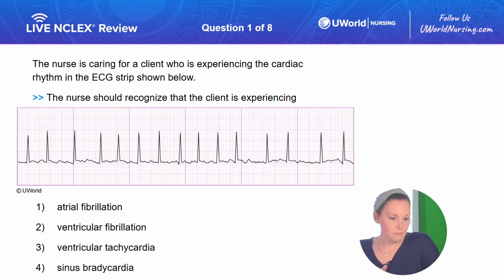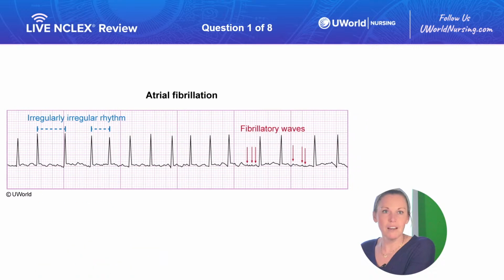Good work, awesome. All right, so good to see so many of you guys here today. I'm seeing a lot of option 1s, so that's great. Good work, you guys. All right, well, I'm going to go ahead and pull up the answer and we'll walk through it a little bit.